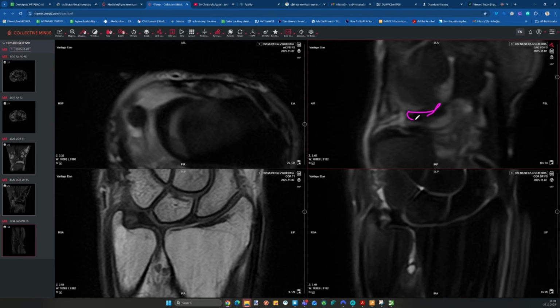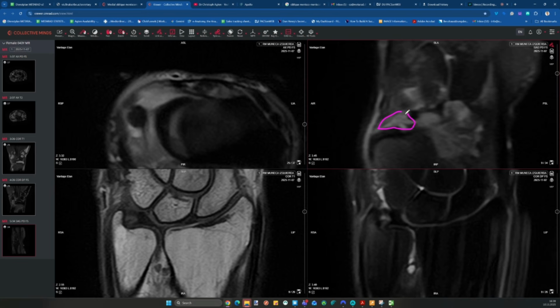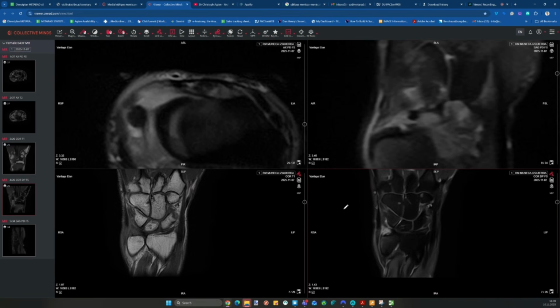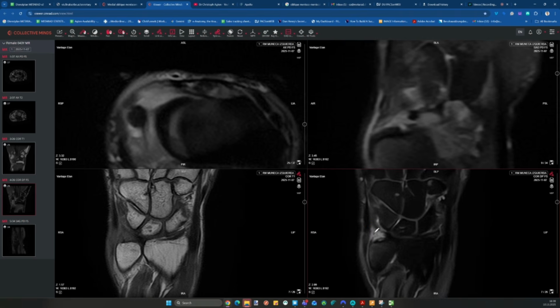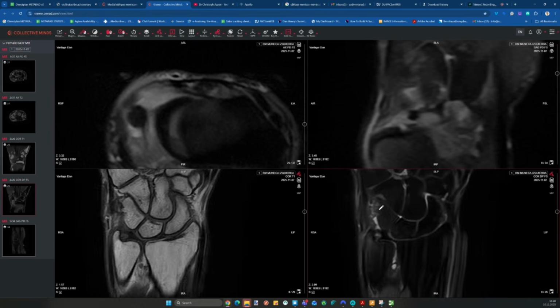The ulnocarpal ligament comes up here like this. I think it's just the edema mainly that is the issue here. Maybe small tears at the peripheral attachment might be okay. But yeah, this depends on the story. Let's say if he is not a post-traumatic case and it's a chronic situation, then I would call this some peripheral irritation here.